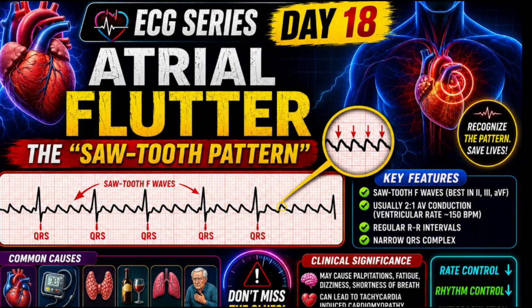So, in our previous lecture, we learned about atrial fibrillation, which is an irregular rhythm with no P waves. Today we will learn another important atrial arrhythmia, atrial flutter. This rhythm has one of the most recognizable ECG patterns, the sawtooth pattern. By the end of this lecture, you will be able to differentiate atrial flutter from atrial fibrillation in less than 1 minute.